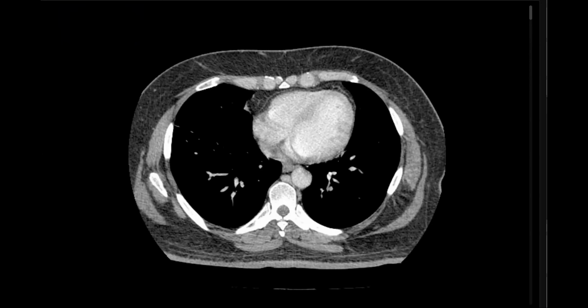Okay, let's see this case. I think we have some history, acute abdominal pain. Okay, ask for control. No answers, please, in the chat box. Anyone can answer on Facebook comments, it's okay, but in the chat box of Zoom, no answers, please. Okay, my friend, we have acute abdominal pain and fever.